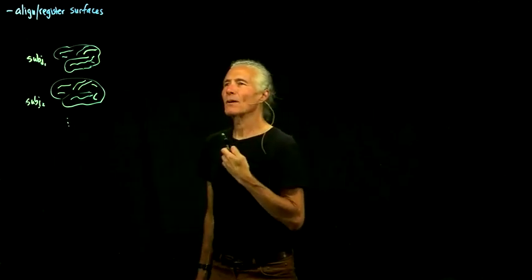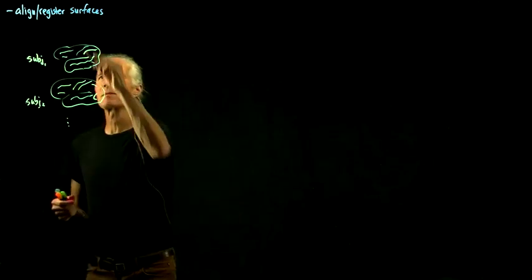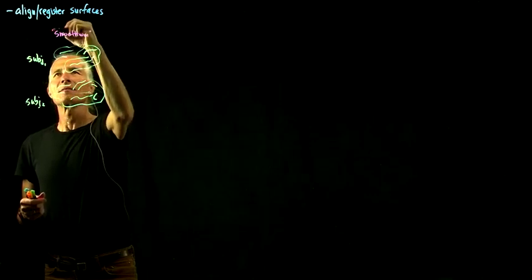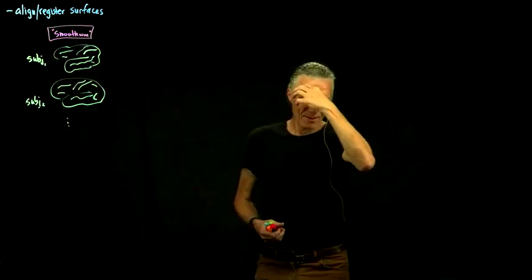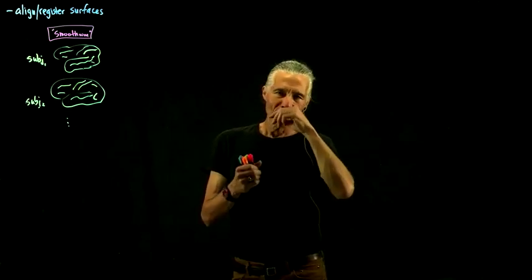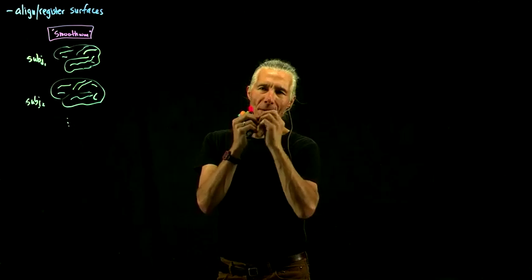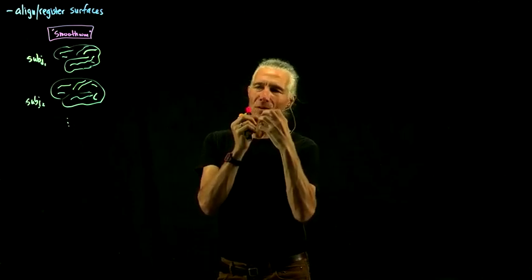So then what we do is inflate the brain. And if you're using FreeSurfer, this surface is called smooth white matter. And then we inflate it. Now, inflating it is not really quite the right word. What we want to do is inflate without stretching. So if you take a balloon that's deflated and you blow on it, it will first just expand out to balloon shape.